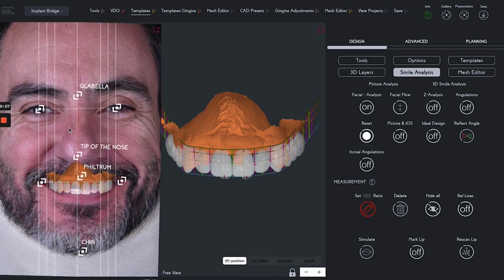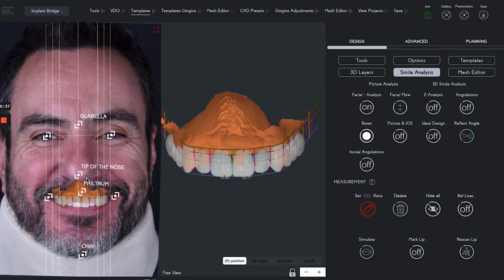Another feature that you can find here is the facial and dental midline. Although we tend to focus too much on the dental midline going exactly on the cupid's bow and not looking at anything else, in prosthodontic steps, we must understand the patient's facial characteristics as well, and then follow that midline according to the patient's facial midline as well. Right? So all these features can be done here in this pre-surgical stage.